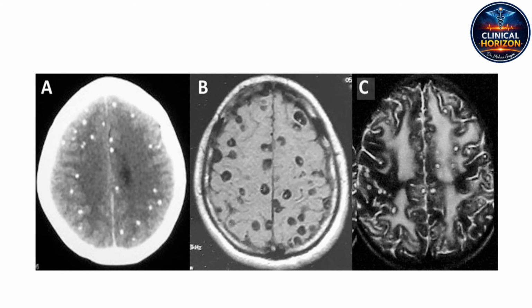On imaging, you suddenly see intense ring enhancement around the cysts, surrounded by significant hypodense vasogenic edema as the blood-brain barrier breaks down locally. Then the inflammation begins to subside as the cyst shrinks into the granular nodular stage. Eventually culminating in the dense calcified dots of the starry sky appearance we just analyzed in scan 10. And the clinical implication of those calcifications is profound, isn't it?